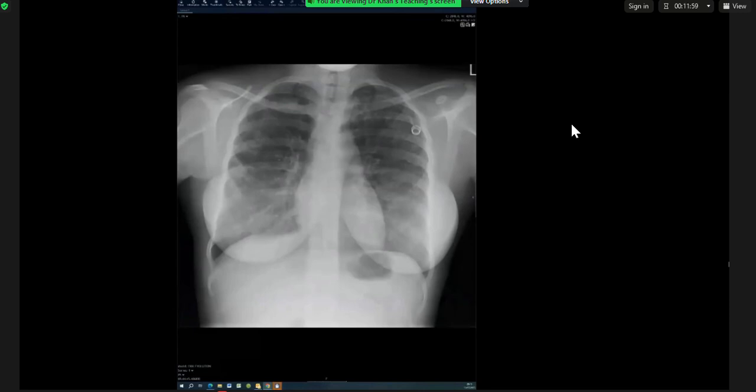Okay, I am presented with a frontal radiograph of the chest. There is no obvious abnormality that is apparent to me. However, I do notice that there is increased reticular nodular opacity in the periphery of the lungs bilaterally, and there is also, I forgot the name for it, the line for a long-term portacath in situ.